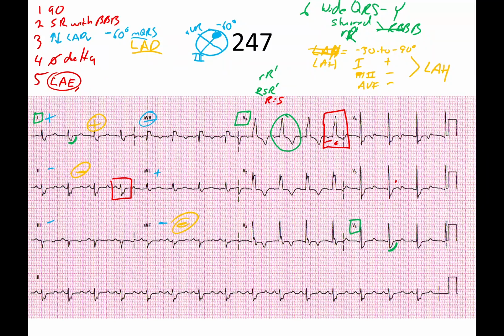This is really important because this is a weird case, or common case technically, where the patient has 2 out of its 3 sections of bundle branches taken out. So think about it as you've got a stool with your 3 legs, where you've got the right, and then you got the left anterior and the left posterior. And this patient's lost 2 out of those 3. Now things are functioning okay, but should they have an MI, or if they are having cardiac symptoms and it winds up affecting this, for all intents and purposes, they've got a complete heart block, where that lower half of the heart, the ventricles, aren't receiving any information from the atria and therefore aren't beating.